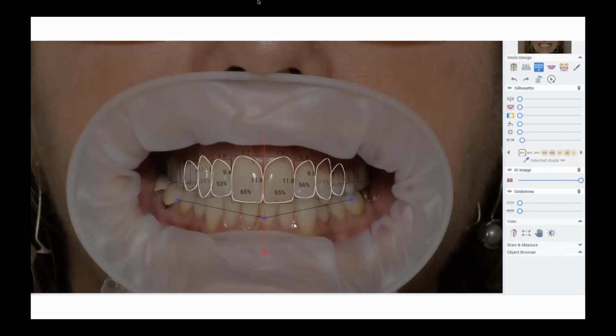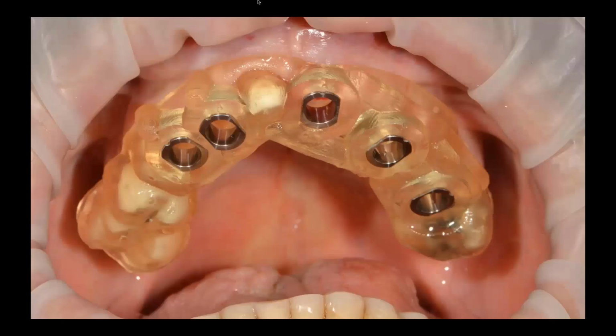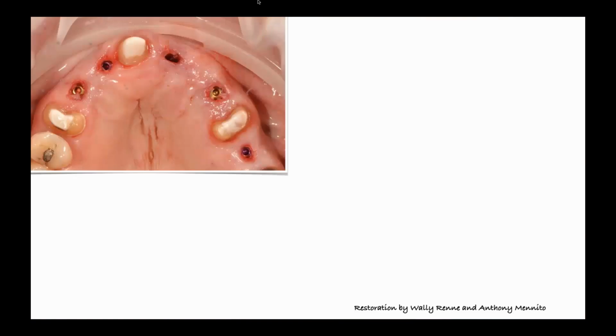We also get this wireframe positional and dimensional information of the teeth. You can export this wireframe and bring it right into your CAD/CAM design. So if you're creating an aesthetic workup, you can translate that into your digital wax-up. And it's a really efficient, clever process. So that's how we tackle these large, difficult aesthetic cases. Plan the implants just like we did, make our surgical guide, and execute the surgery.